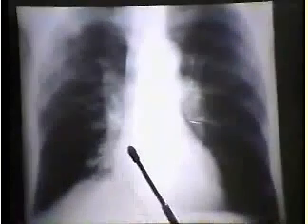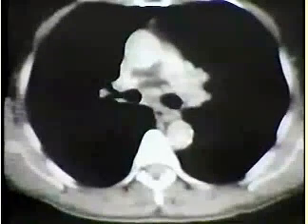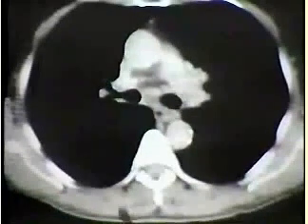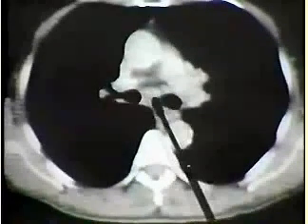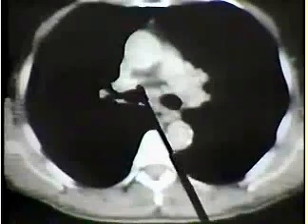This case, however, there is a carcinoma down here, but the mediastinum is really quite unremarkable. Even if this film were better quality, we still would not see any abnormality, and if we did an esophagram, we would not see any abnormality, and here's the reason why. As we look in the subcarinal region, we see the separation between the bronchi, and you notice there's a soft tissue mass here, displacing the fat anteriorly.